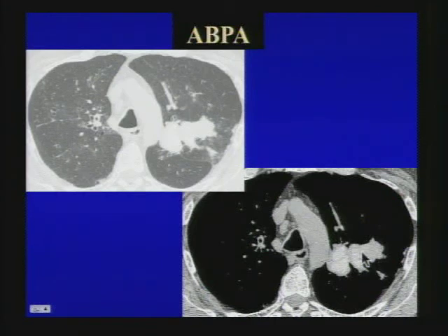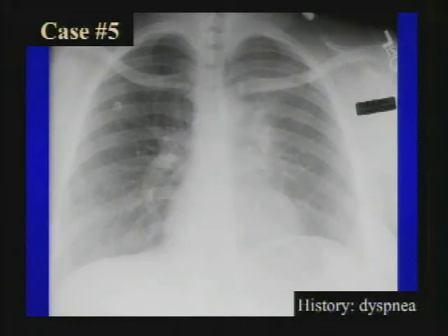Okay, high-density mucus, this is the CT to correspond with that. High-density mucus in an impacted dilated bronchus. Beautiful example of allergic bronchopulmonary aspergillosis. Ask for a history of asthma. Classic, what is this? Left upper lobe collapse. All right, let's say it all in one big thing.